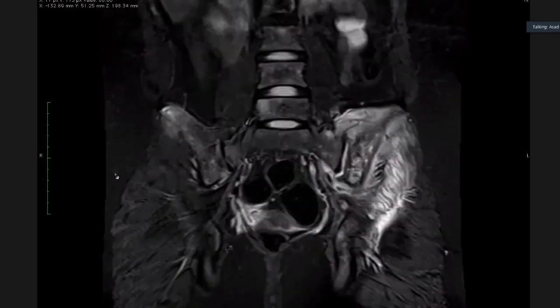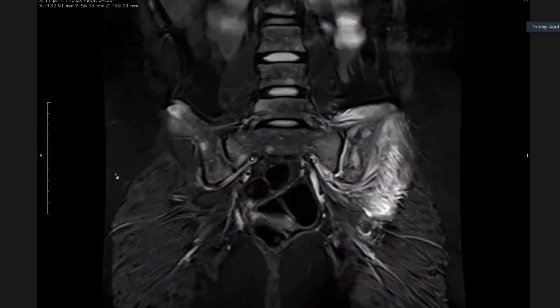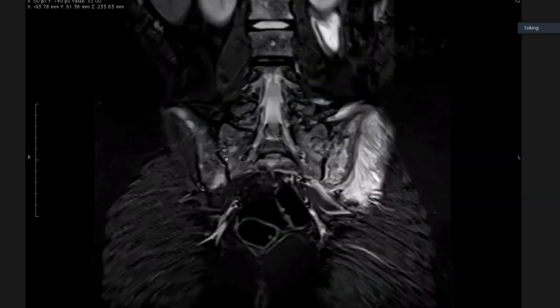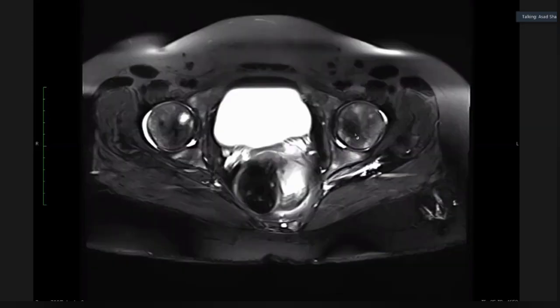Okay. So if I stop there, let me stop there for you. What do you see there? There is hyperintense signal intensity noted. Where about? Sir, in the bone, say in that left ilium, but other bones also show hyperintense signal in them. So right ilium. Yeah, even the femora, you're seeing these kind of bright spots, aren't you?